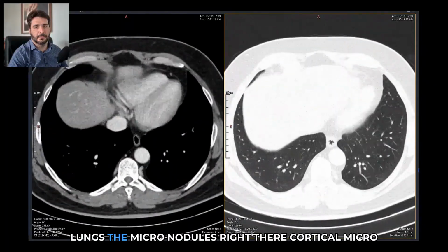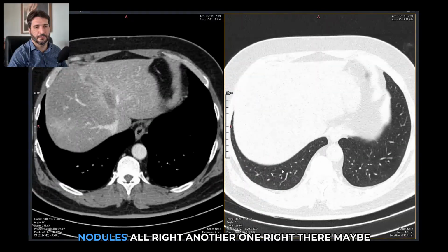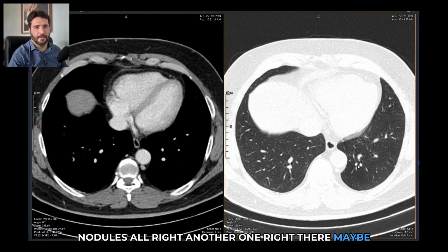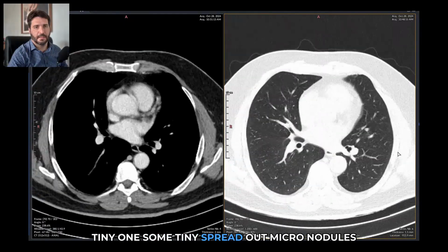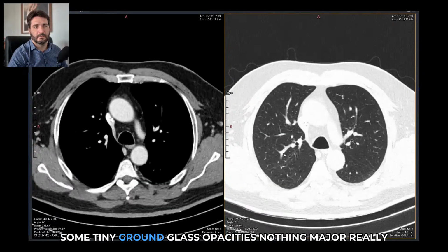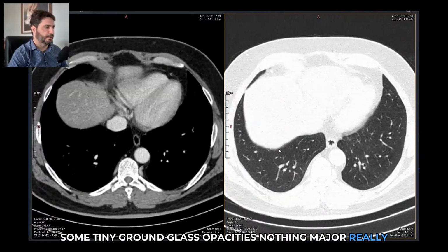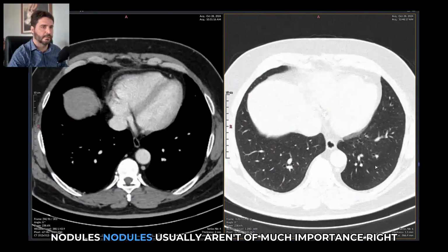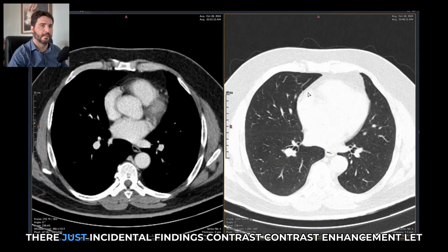Right there in the lungs, some micronodules, cortical micronodules. Another one right there, maybe a tiny one. Some tiny spread out micronodules, some tiny ground glass opacities. Nothing major really. Those micronodules usually aren't of much importance.